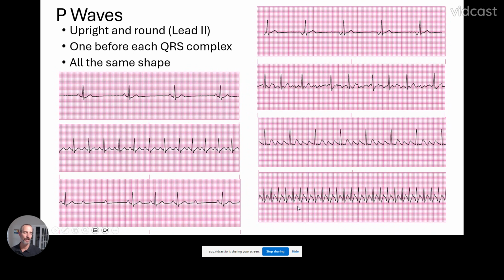So it could be atrial flutter. It could be a junctional tachycardia, and we're actually looking at T waves. In other words, it could have P waves like this that are being buried in the T wave, and it could be sinus tachycardia. So we don't know. The beautiful thing about that is when it's going this fast, we just call it supraventricular tachycardia.